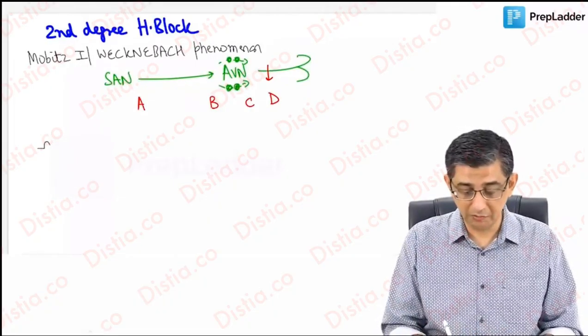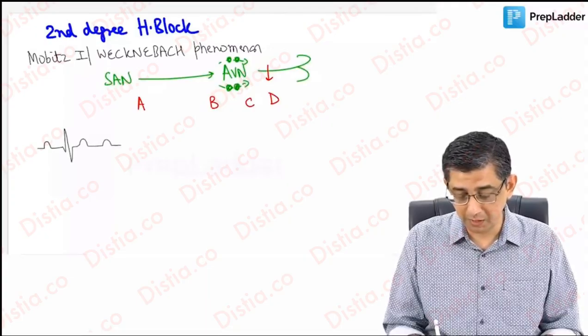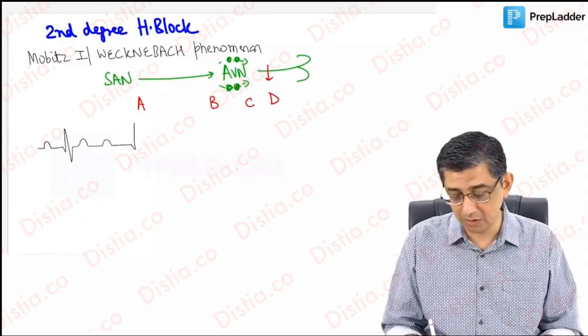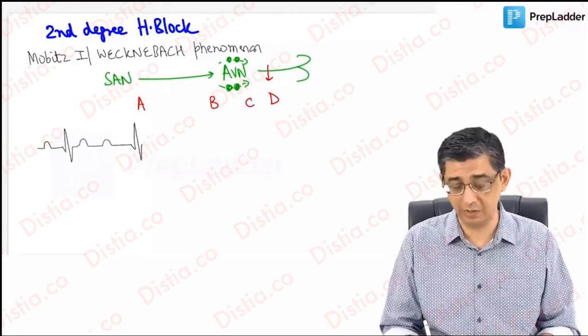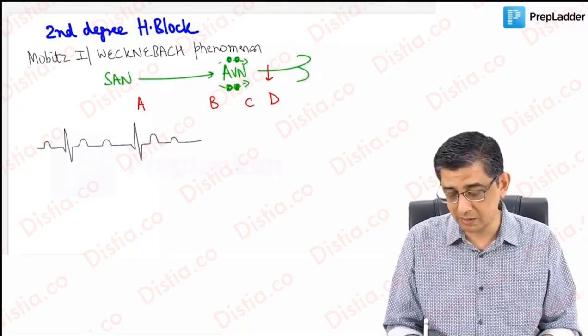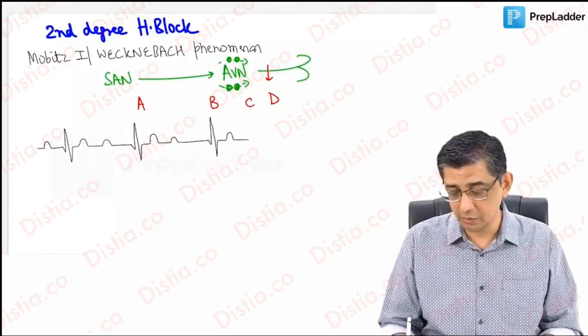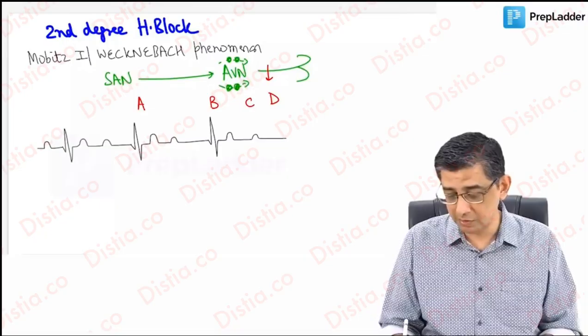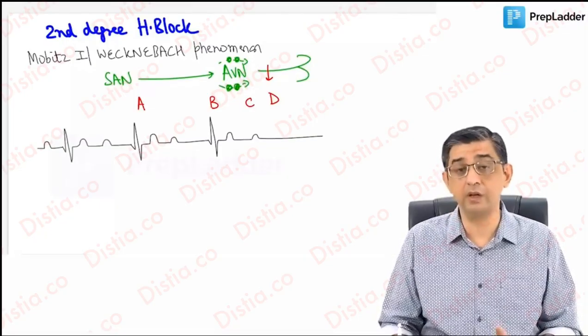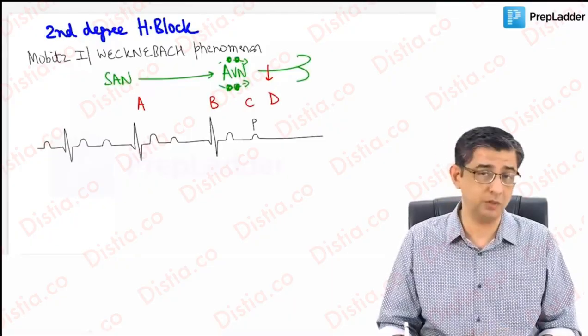When you scan the ECG from left to right, you will notice a progressive increase in the PR interval of this patient. Please be patient while I hand draw the same before you, because the easiest for me is to show you an ECG, but then a lot of times you might miss a couple of facts. So let's try to hand draw this so that we can get a better orientation. Whenever you see the ECG of this person, you will always see an area where after the P wave there is no QRS complex.